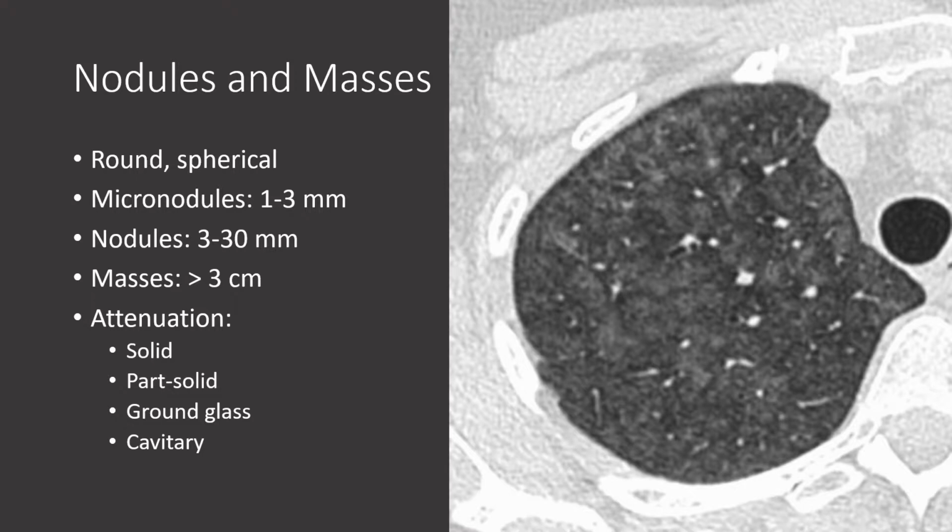At first, one may think that the CT on the right-hand side demonstrates a diffuse ground glass abnormality. That is partly true. However, on closer inspection, we notice that there are numerous small ground glass nodules. These nodules appear to be in a centrolobular distribution rather than confluent ground glass as we had seen in earlier cases of pneumonia. These centrolobular ground glass nodules are characteristic of subacute hypersensitivity pneumonitis in this patient who had birds at home as the exposure allergen.